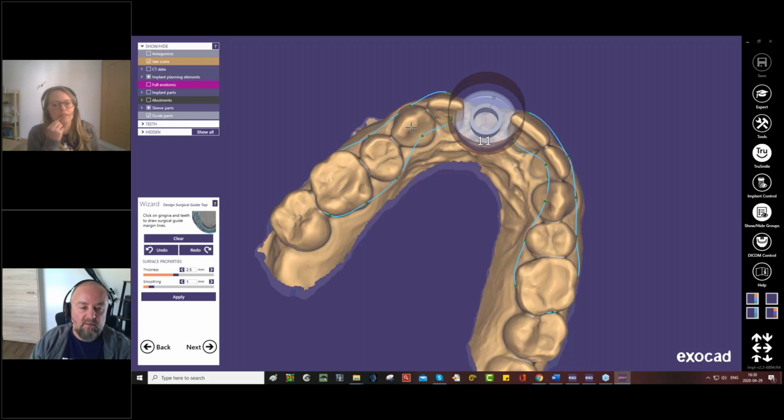But anyways, I think it's not a problem if all the sleeves are included in the first splint, so you just have then not to use this slot for the sleeve and create the second guide. That's what I would say. Alternatively, if the problem is that the sleeves don't have enough place, when you do your implant planning, you can choose to not place sleeves for all 4 implants. So say you have 4 implants, and then you just place a sleeve for 1 and 3, and you save the 2 and 4. You don't place any sleeves for implant 2 and 4.